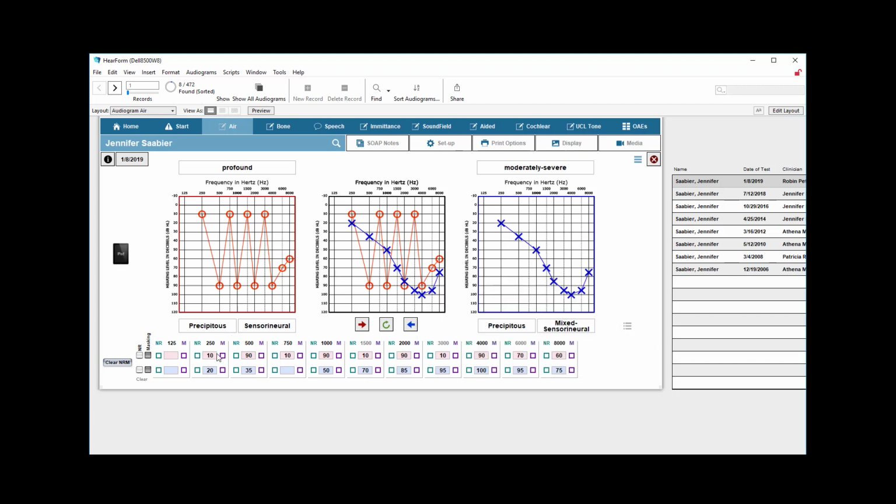So down here we have a very light red and very light blue area. You can manually change the information right there if desired, and you'll see how it redraws the graph right away. So you can update that information as needed manually this way. You could type in a number, but we suggest that you stick with the numbers here because the system really needs it to be a 0 or a 5 in the ending of 15, 25, 35, etc. So it's just as easy to select it from the drop-down list of choices.